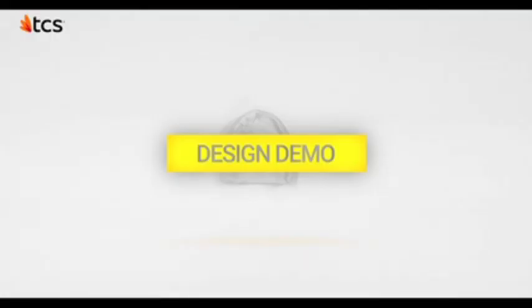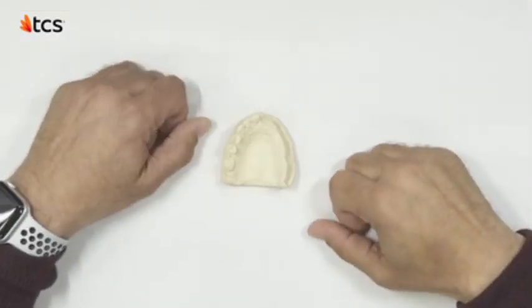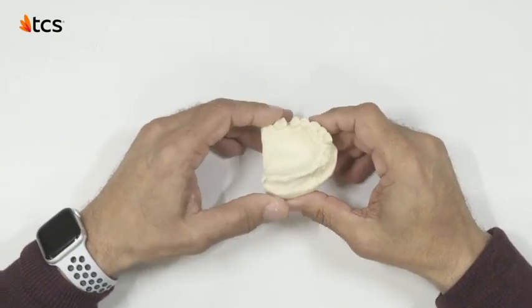Welcome to Design Demo 2. We will begin by assessing the design plan and amount of undercut for this free end saddle case.